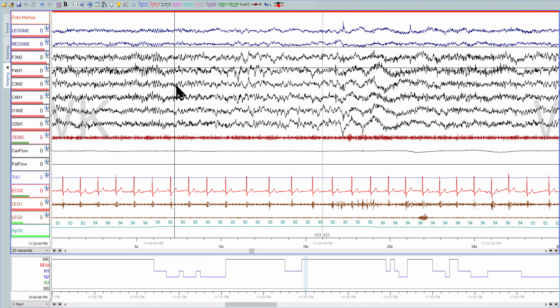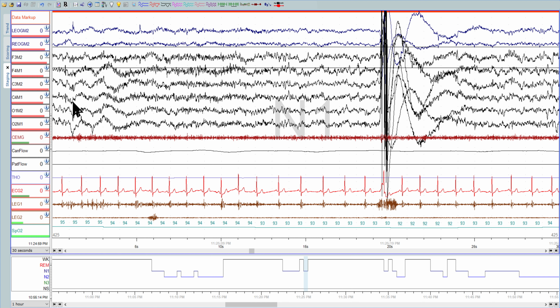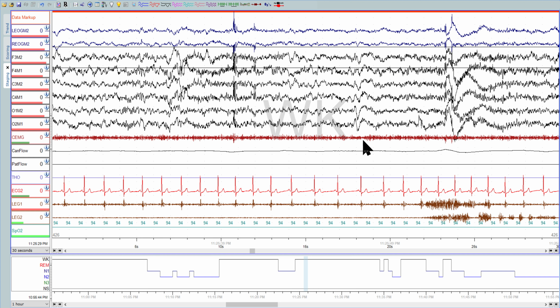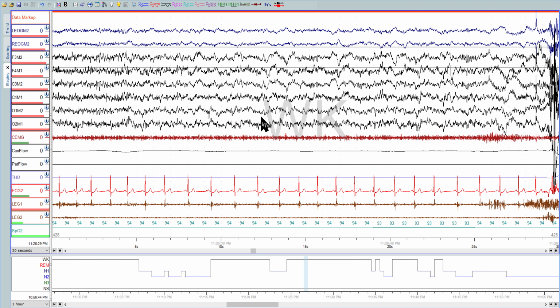and if that's 10 seconds, 11 seconds. So this will be an arousal here, right there. And another arousal, but it's not 10 seconds, so we won't mark it, but this would be wake. And then wake, good. Wake, good. This would be 1, however, it drops off here. And then this is all stage 1.